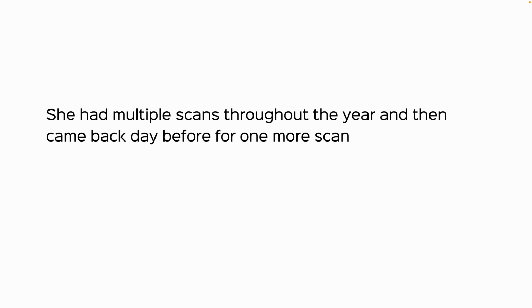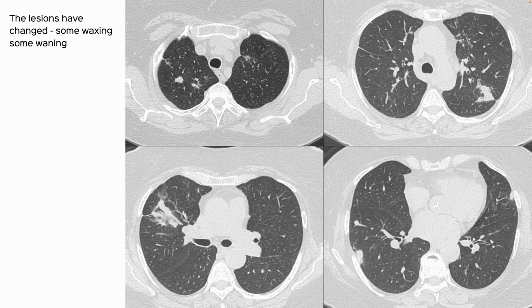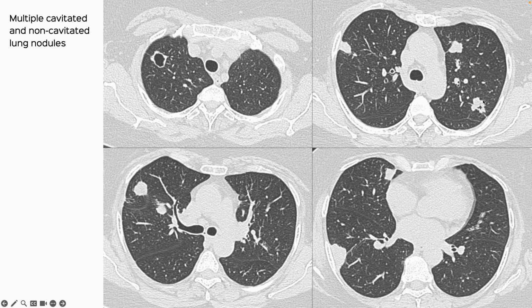She had multiple scans throughout the years, and then came back the day before for one more scan, and I read it this morning because we wanted to remove all the old scans. Some of the lesions have changed character. This one has become a little more confluent. This one has changed itself. And if you look at what we had in 2013 and now 12 years later, there is a change in the pattern.